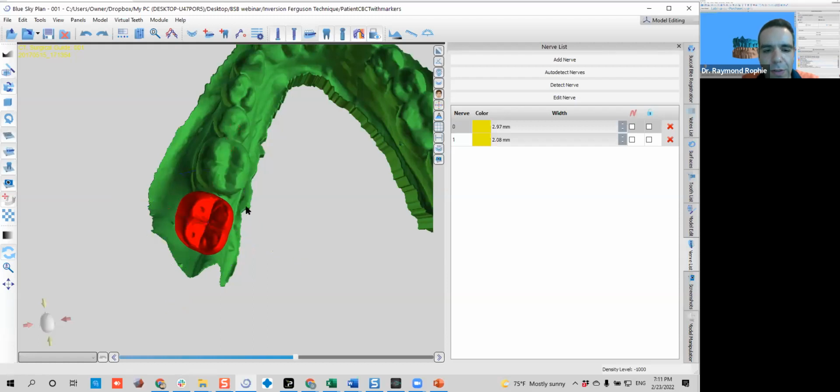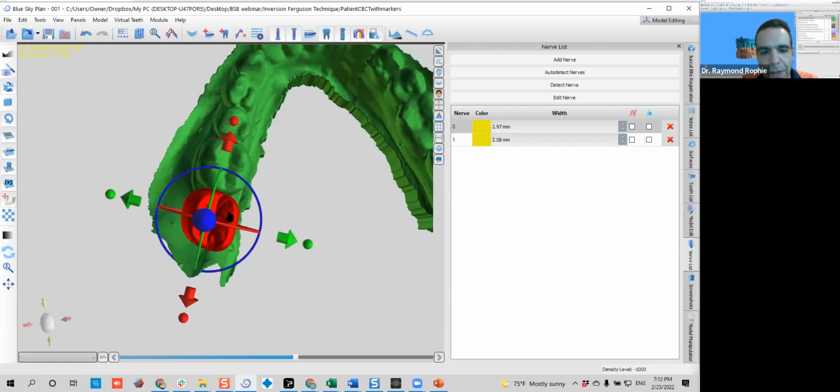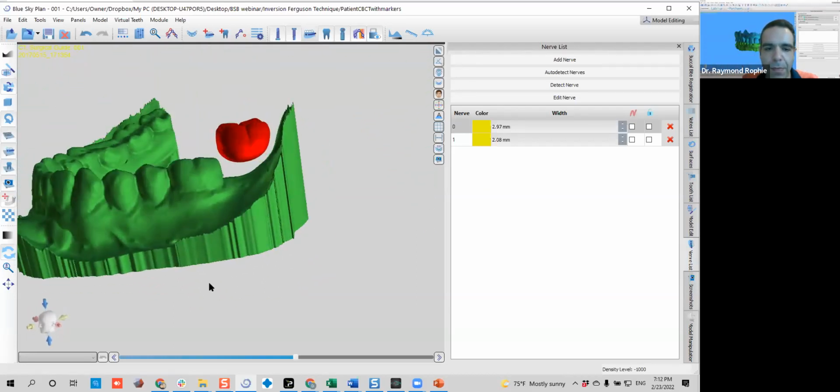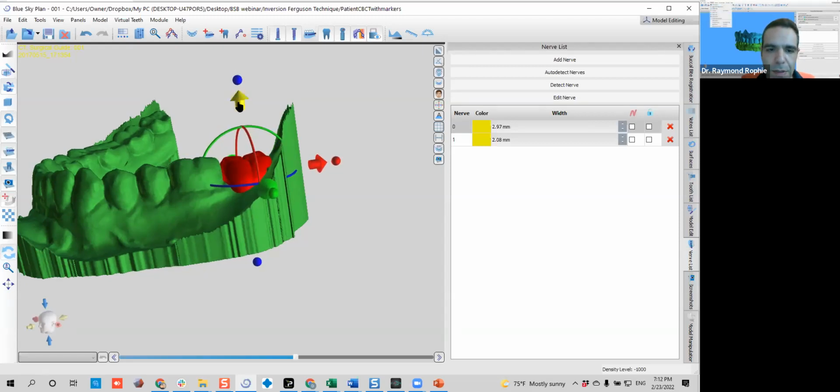Now what you want to do is control your rotation, place the tooth in the most ideal position for this view, and then change the view. On computers, fewer clicks is always more efficient. Here, I fix this view. I might have more errors, but at least here I'll say that it's an ideal view.